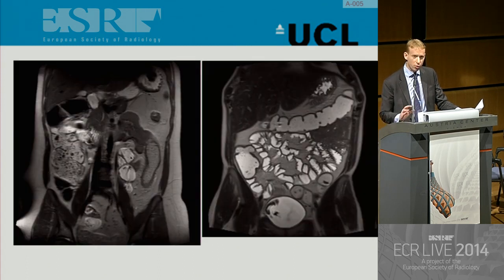I mentioned endoscopy before. These are two cases with Crohn's disease, with proven colitic disease. The first one, I think we'd all agree, we'd all be happy with. There's an abnormal thickened colon, and we can diagnose that pretty well with MR. This patient's also got colitis with aphthous ulcers on their colonoscopy. Most of us would call the colon normal there, so we're not going to see the small aphthous ulcers. So how does that tie into how we use our cross-sectional imaging?